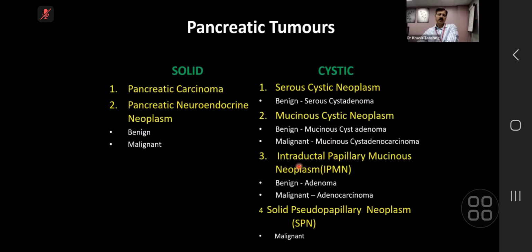Now, the final thing in the last 20-25 minutes is to cover these cystic lesions. And candidate 7, I'll give you just one more case, and then candidate 8, you should be ready. Now, if you see this, cystic lesions, or should I say cystic tumors here? So not lesions, but tumors.